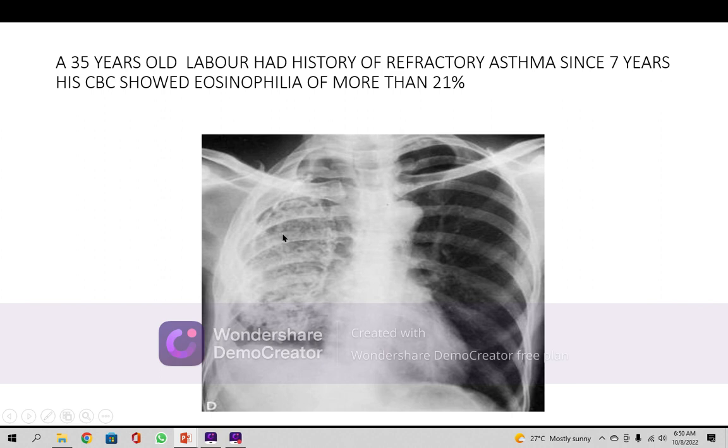thickened fibrosis here, fibrotic patches are there, and there are air bronchograms inside it, honeycombing, that is called, on this side. And the other side is showing what is called compensated emphysema. The dome of the diaphragm here is all right, and on the left side it is all right, costophrenic, cardiophrenic, again no pleural effusion.